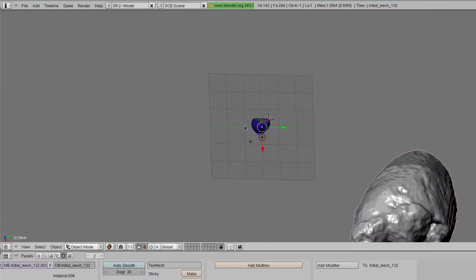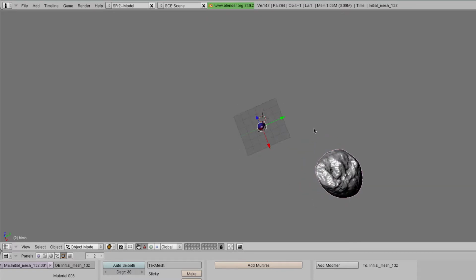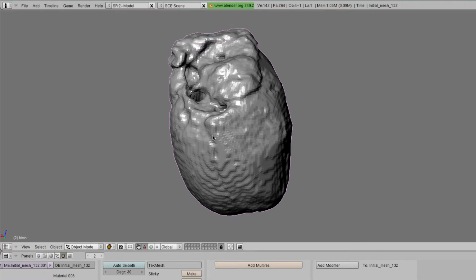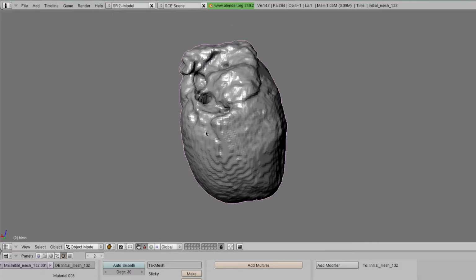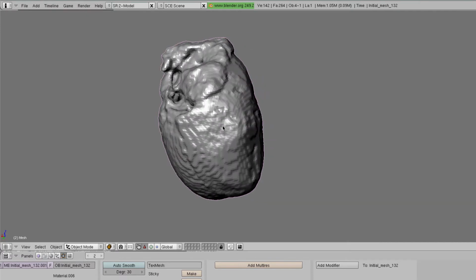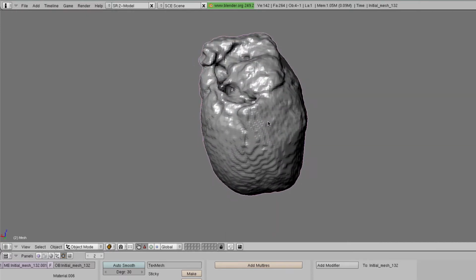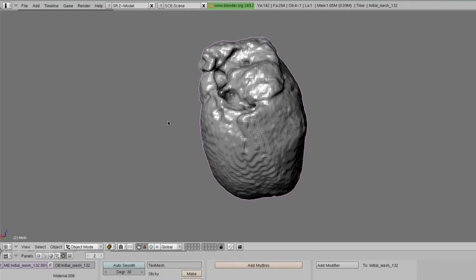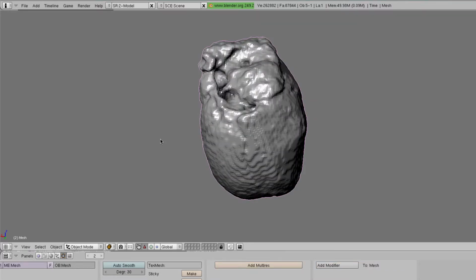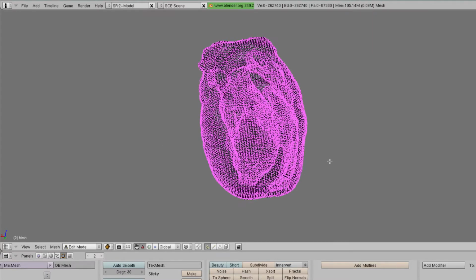The segmentation will probably be somewhere offset on the side of the screen. To scroll in and out, use the scroll wheel. To translate the view of the object, hold Shift and use middle click. In Blender, we will be using 2 views, Object Mode and Edit Mode. In Edit Mode, we are able to select vertices and edges, and in Object Mode, we can see the whole view. You can switch between the two with Tab.